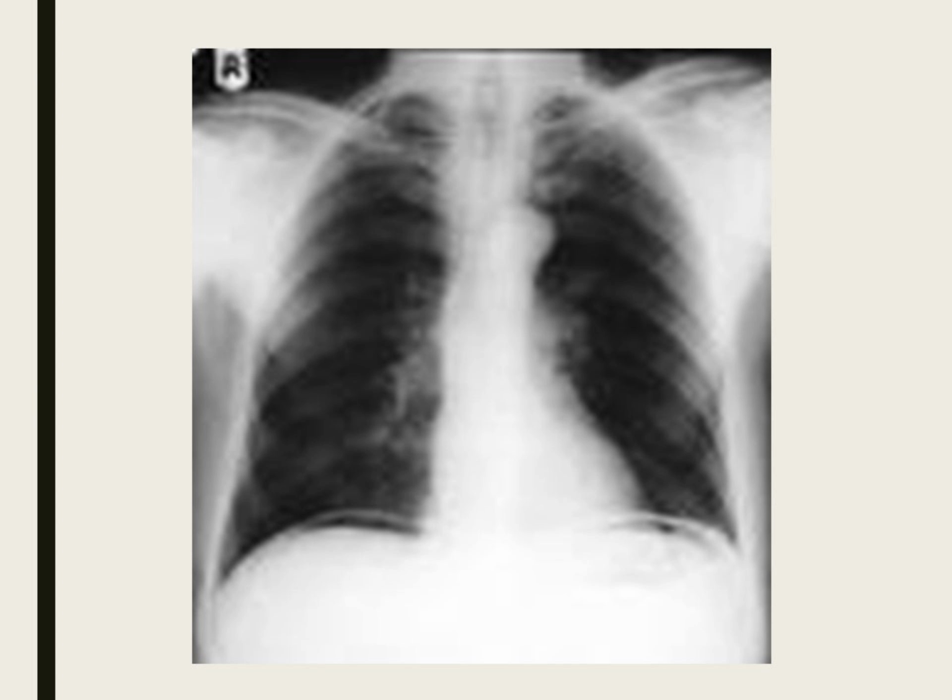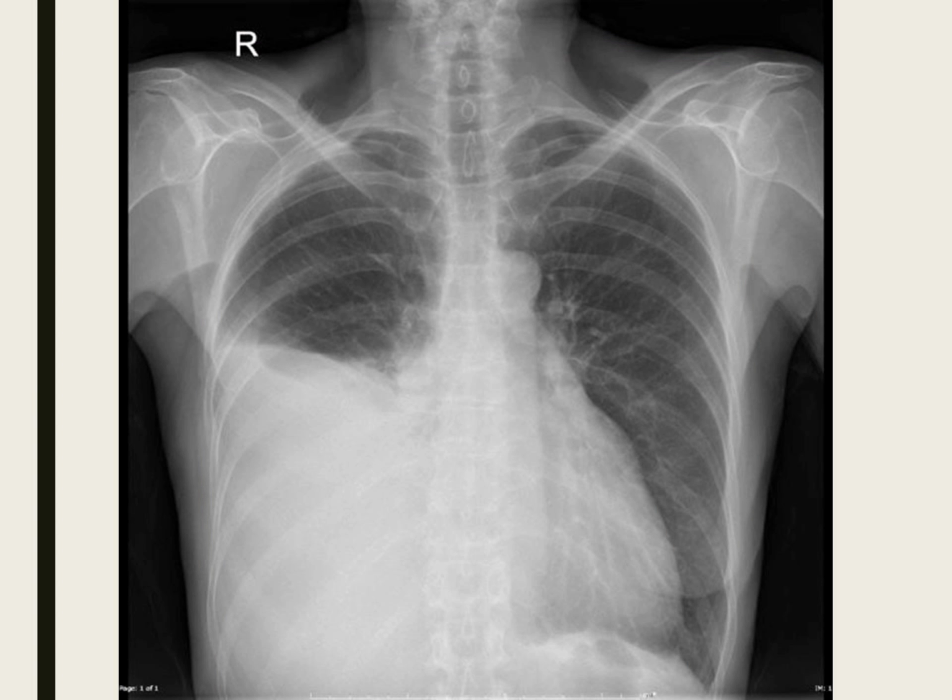So, again, if you don't do the A, B, C, D, whatever, in my mind, I will miss it. I'm like, yeah, actually, okay, whatever. It's like you don't look specifically for these markings, right? So, what about this one? What do we got here?